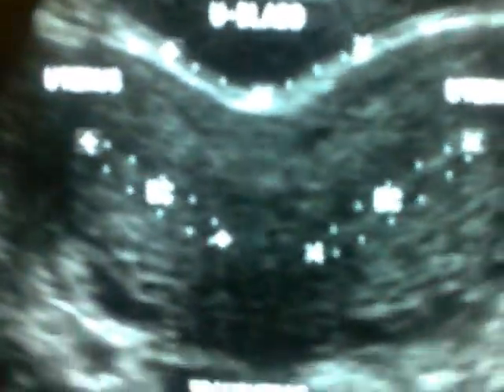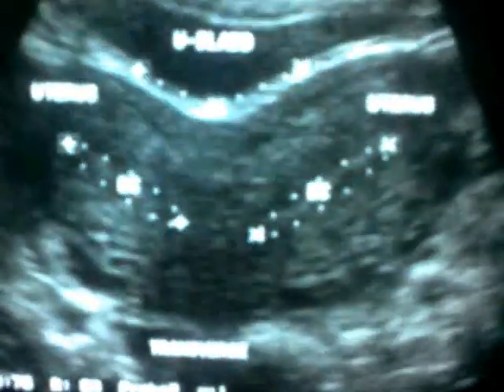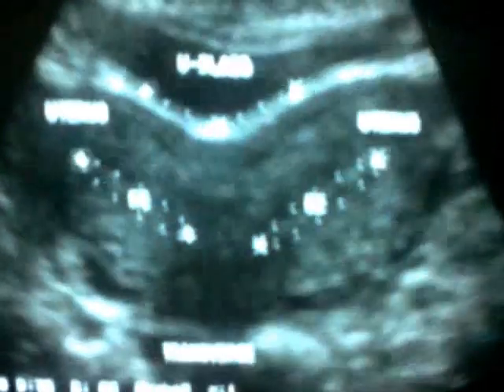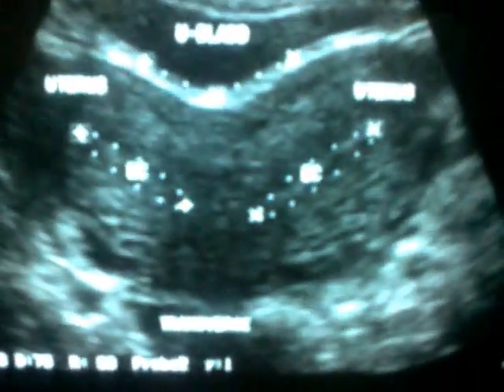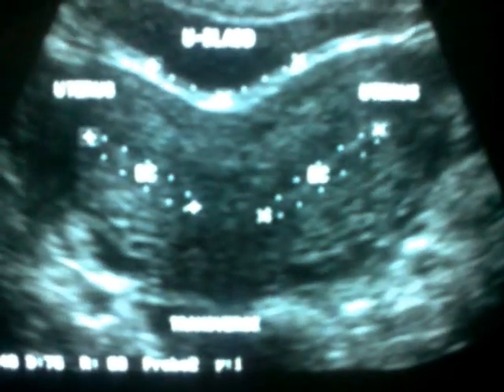Okay, now this is an image study of a female. She came to me in agony and I had to do it as soon as possible. So that's the reason at present I am giving you the pictures I saved.